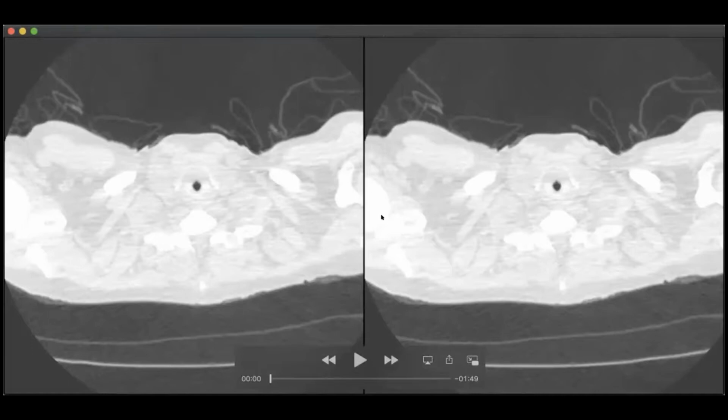This is a study where we have, again, the source images here on the left, and we have the ClearRead vessel suppressed images on the right. And I'm going to scroll through this. This is a case that I came across early in our implementation. And again, it is an example of a nodule that was missed on a prior CT.